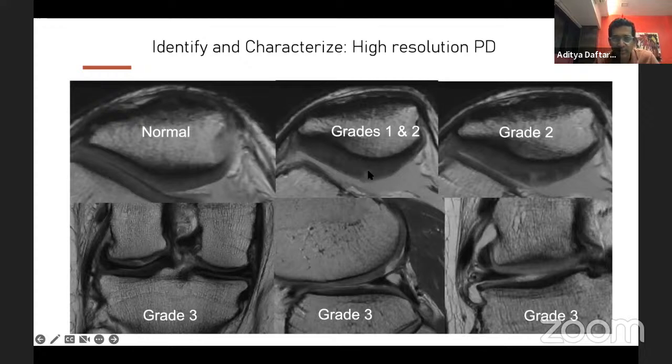You can see this superficial chondral fissure here, a grade 1 chondral fissure. Here you can see grade 2 going through 50% of cartilage and starting to shear laterally here as well. Here you can see a grade 3 lesion. So you see how that lesion has tracked through the superficial layer and then gone right down to that radial zone and is forming that radial zone flap. And then these are the cartilage lesions that delaminate really fast and lead to rapidly progressive osteoarthritis.